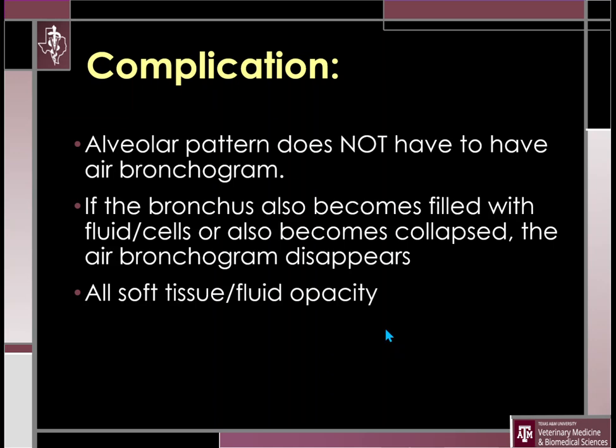Alveolar patterns do not have to have air bronchograms. So if that bronchus is completely filled with fluid or cells or becomes completely collapsed, then the air part disappears and all we will see is soft tissue or fluid opacity.